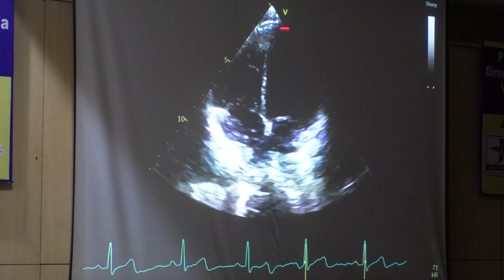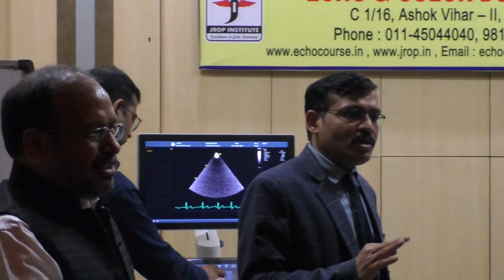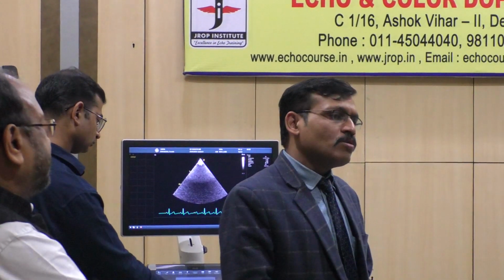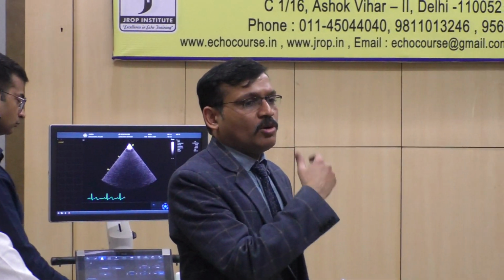I have a question about the pulmonary veins. May I? Yeah, go ahead. If you name the upper and lower, in the 4 chamber view, can we see all the 4 veins or 3 veins? Show them upside down now. Because Dr. Sahana is working in NICVD at Dhaka. She is assistant professor right over there. Yes, the 4th vein, left upper, is difficult to see in this view. So you go to the short axis view. So for left upper, you have to go to the parasternal short axis view. The left upper pulmonary vein is important for us, even in diastolic dysfunction. For that reason, I'm asking.